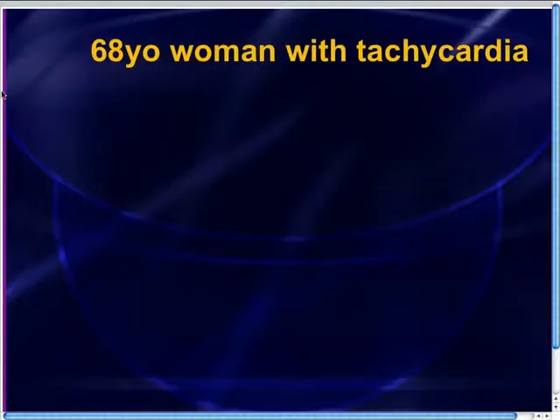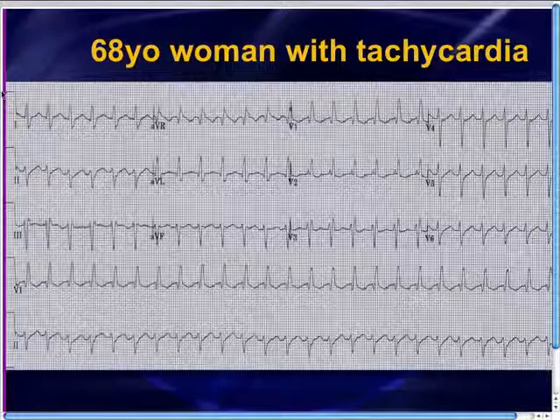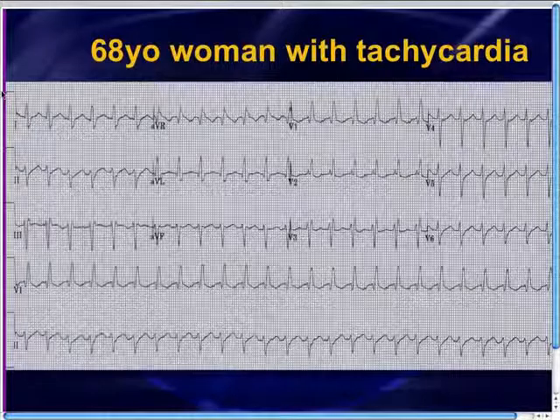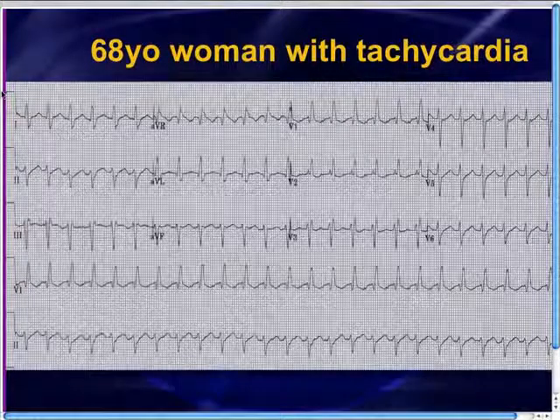So, of course, we got a 12-lead EKG to find out what in the world is going on when she got brought up front. And she's got a wide, complex tachycardia. So let's forget about her foot. It is completely unrelated to our main concern. I think maybe she had a little crack between one of her toes and a little athlete's foot or something like that, whatever. But she's got a tachycardia which is wide, complex, and regular.